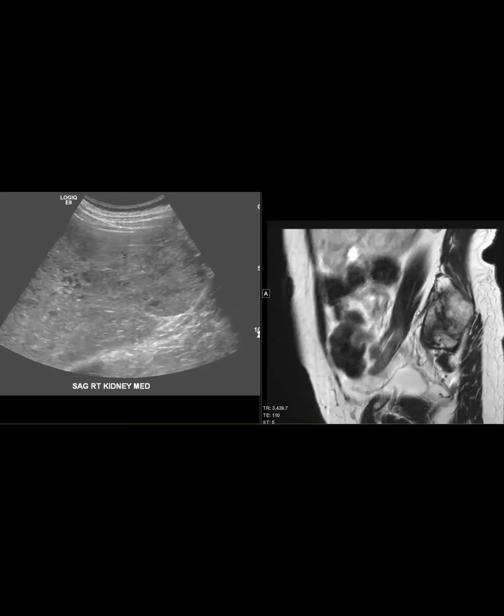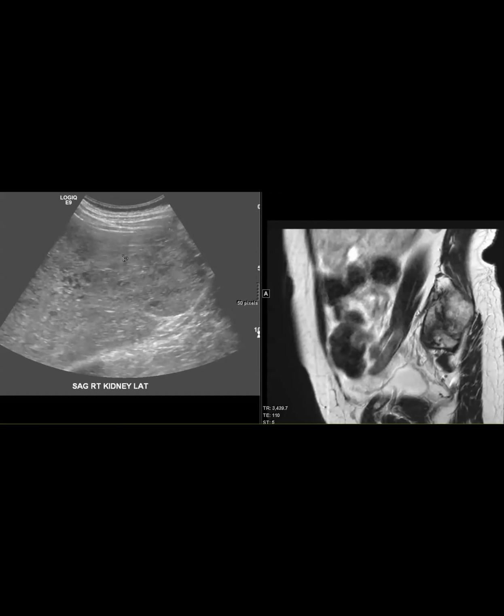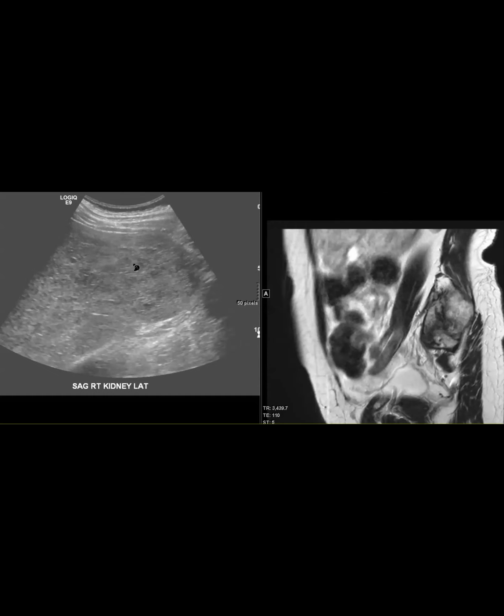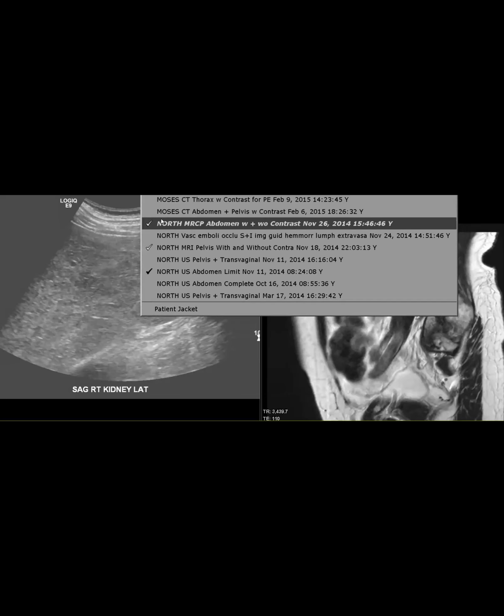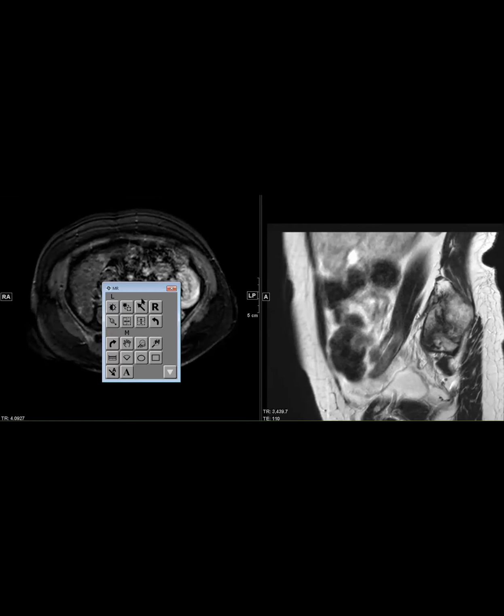Anyway, here is the liver on ultrasound. You can see that the liver has a very, very abnormal appearance, just kind of heterogeneous. Now, the patient had no history of anything liver related. Oh boy. Looks like a diffuse liver disease, right? Not focal. Right. So based on these images, we recommended MR for better assessment, and here is the MR.